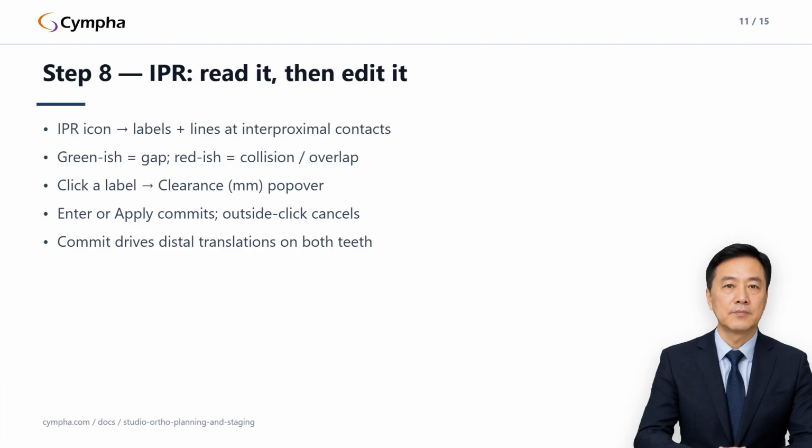Studio to Ortho Plus. Finish your edits, click the download icon on the case bar, and Studio exports the current case as an XML named after the case base name. Import or merge it in Ortho Plus. The reverse: export from the desktop, click the upload icon in Studio, and pick the file. Parse errors and mismatched cases show in an alert.